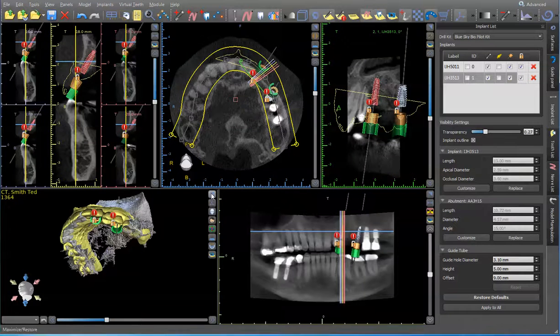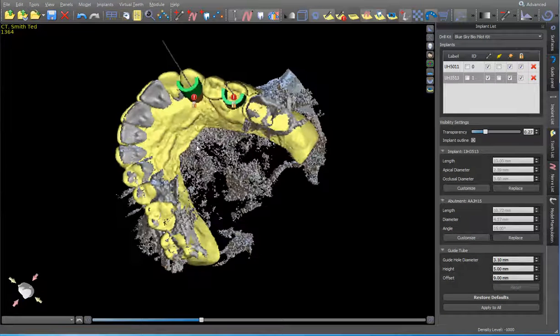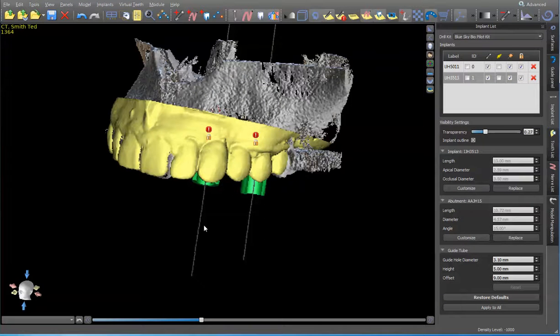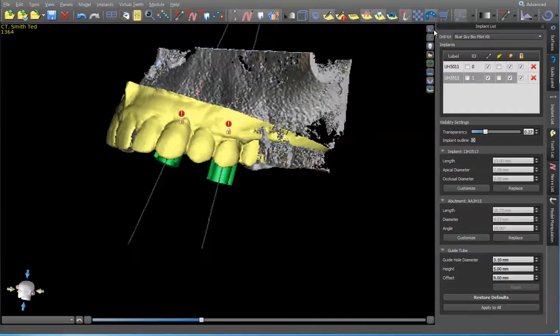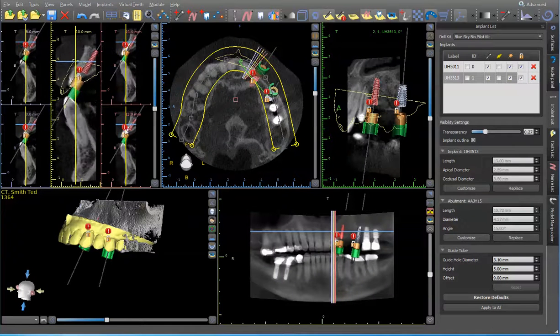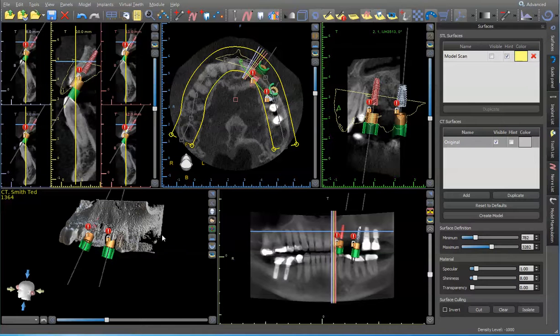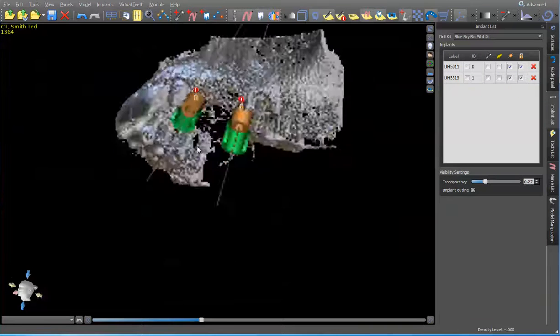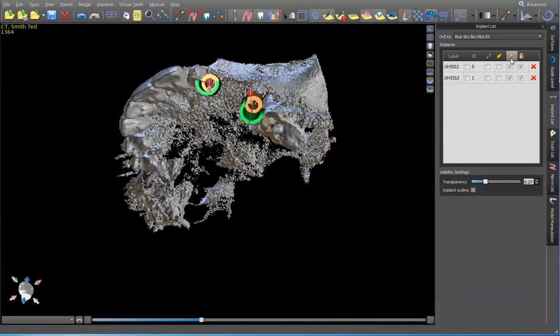So this patient, we're going to make a surgical guide to replace teeth number 10 through 13. We're going to have 10 as a cantilever off of a 3-unit bridge and out of occlusion. We've already meshed the DICOMs together, and the only interesting thing about this case is the CT scan was taken without implants, or without the teeth in place.